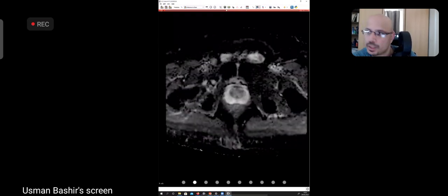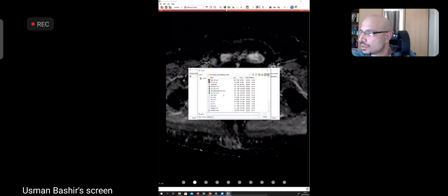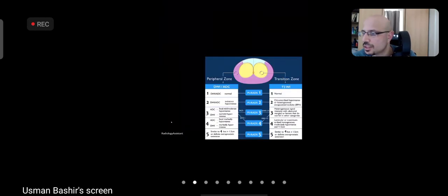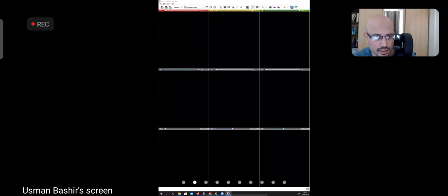This app is so rubbish that it might crash when I try to go back to that first template. But fingers crossed. Now you can have tea, whoever asked what the fourth image was, because it crashed. Let's open it again.